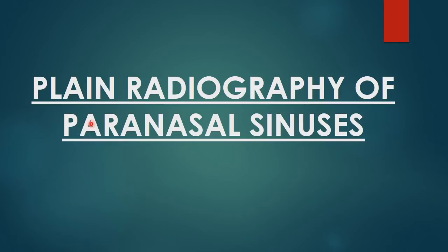The topic is plain radiography of paranasal sinuses. Here we will discuss some plain radiographs that are usually used for visualizing paranasal sinuses.